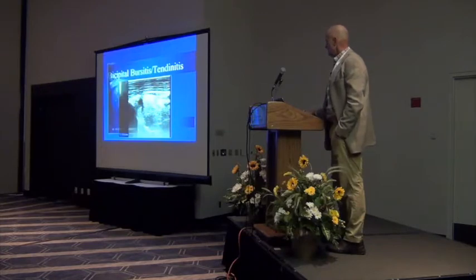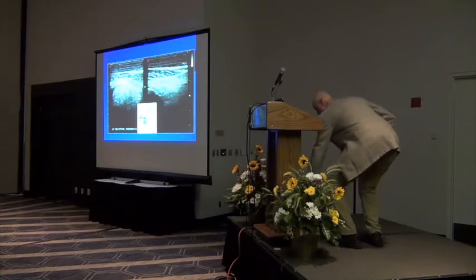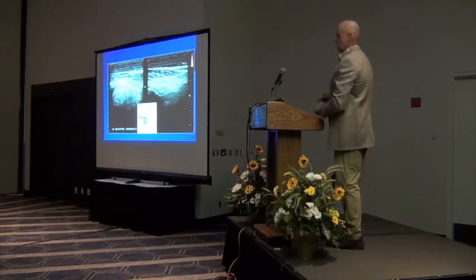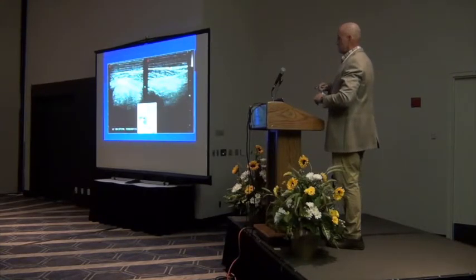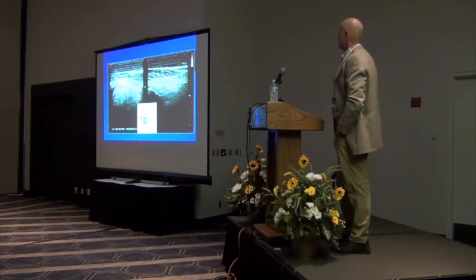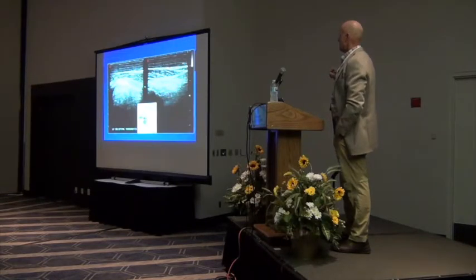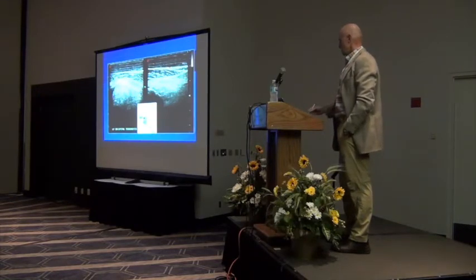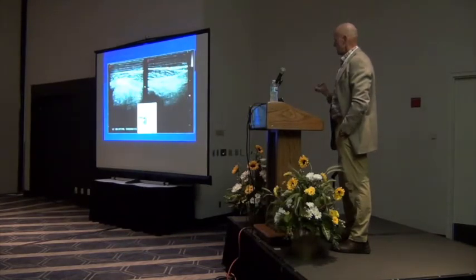Now, I'll show you some other cases that were actually septic that developed a bone response down at that same location. This is a young horse that came in out of the field. Lame, shortened cranial phase of the stride, bone scanning, and he's got quite a bit of change. Even though this looks very consistent with what I told you earlier, the heterogeneous appearance, it's right at the enthesis. And you can see that there's some change in the fiber pattern as it comes and attaches to the supraglenoid tubercle. So in that instance, bone scan down the bottom told us right where it was.